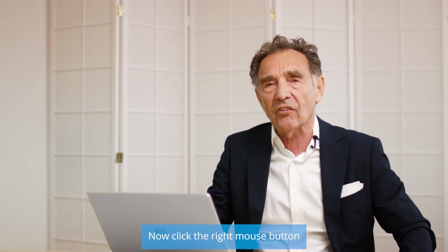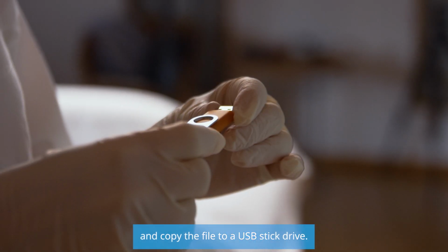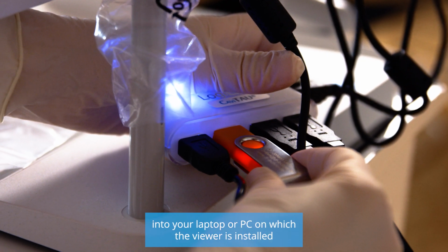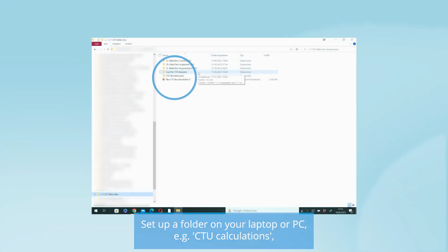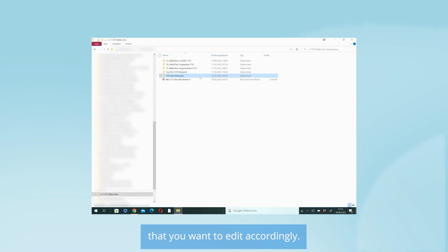Now, click the right mouse button and copy the file to a USB flash or stick drive. Plug the patient file on your USB stick drive into your laptop or PC that is connected to your CaviTAU viewer. Set up a folder on your laptop or PC, for example, CTU calculations, in which you will later save all your patient scans that you want to edit accordingly.